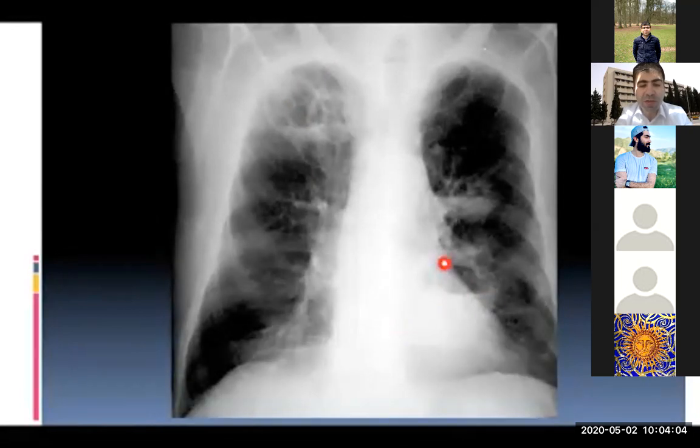So this is a cystic lesion with fluid level. This is a case of hydatid most likely because there is a water lily or undulating membrane here on this side. So we suppose that this is also hydatid.